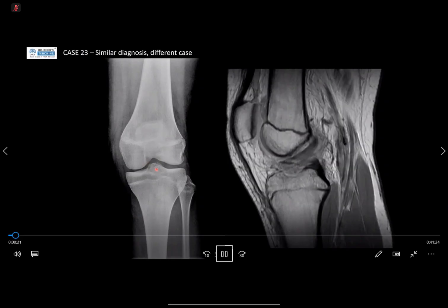The tibial spine is irregular. There will be quite a bit of soft tissue swelling. There'll be a twisting mechanism of injury. And often there's a lot of joint effusion. You see that, and you just want to make sure that you do an MR. It depends on what the orthopedic surgeons want. Sometimes they say actually no, it will heal on its own, but often they'll say just do an MR to ensure there's no other internal joint derangement.